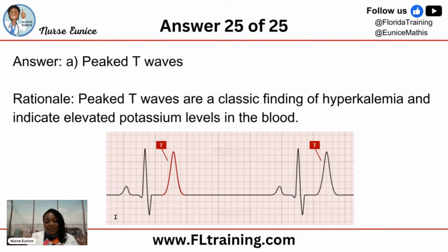So anytime you see that it's irregular on the monitor and it's elevated, make sure you notify your nurse, or if you are a nurse, make sure you call that doctor to get that 12 lead in right away. And they're usually going to ask for a 12 lead and some labs because we need to figure out whether or not it's from the actual heart or if it's from elevated potassium levels.